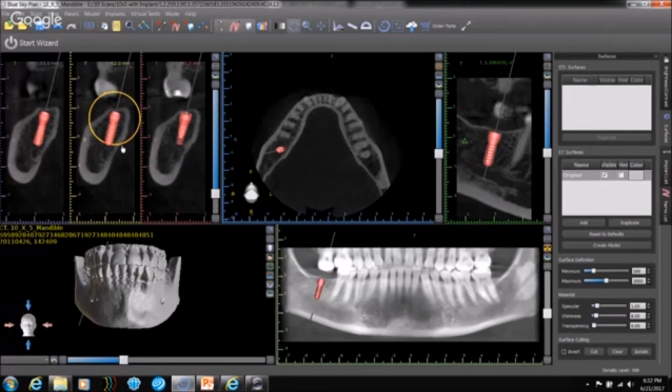And of course, you can adjust. We'll get to the implants as soon as I finish this component. So it is very, very important to know the angulation as well. So once you start with the implant planning, now it becomes a matter of choice what kind of implant you pick, what kind of placement or what kind of guided surgery you are doing. That is all an individual matter of choice, not the images, nor the planning software determines that. It is the patient's anatomy that determines that.